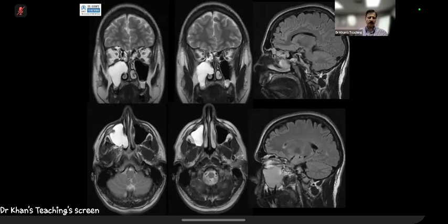Now, if you see here, the lesion is in the maxillary sinus. Here, it does not go into the ethmoid sinus. It is sitting in the nasal cavity. So this is the inferior turbinate, this is the inferior turbinate, and the lesion has gone here. So through which structure will it go here? It must have caused expansion of something, and that is why it has gone here. So we will go now into a teaching mode regarding anatomy, and we will come back to this case.